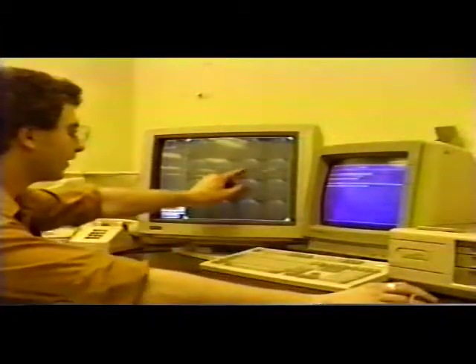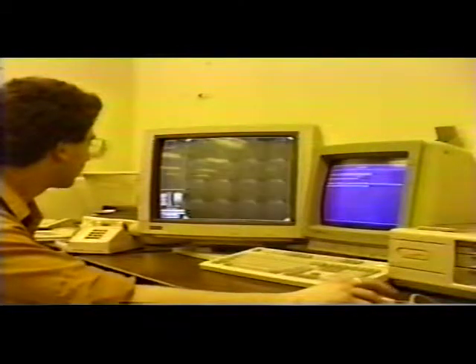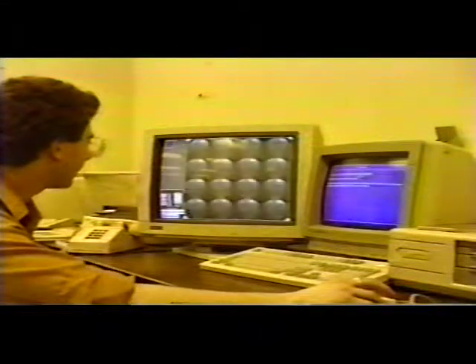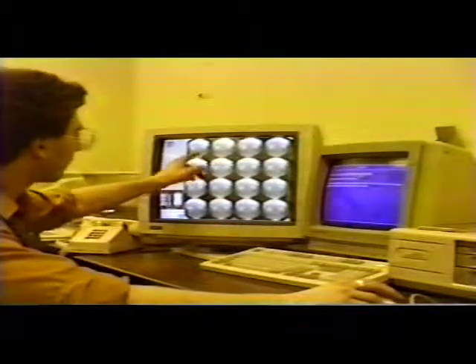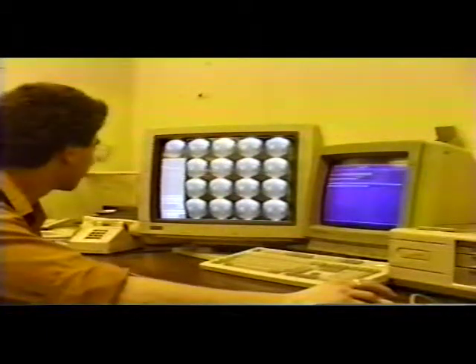It's a little hard to see the kidneys. You can use the contrast control to bring down the max until it's really bright. Now these are all time images, and one of the features of the system is that we can animate them by clicking on the movie button.